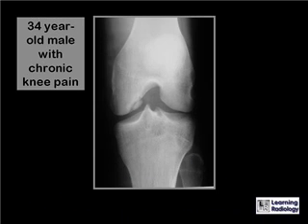This is a 34-year-old male with chronic knee pain. What do you see?